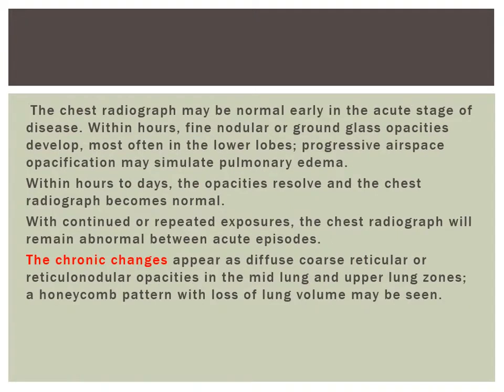The chest radiograph may be normal in the early and acute stage. Within hours, fine nodular or ground glass opacities develop, most often in the lower lobes. Progressive airspace opacification may simulate pulmonary edema. Within hours to days, the opacities resolve and the chest radiograph becomes normal.